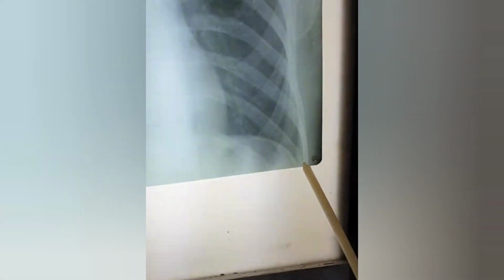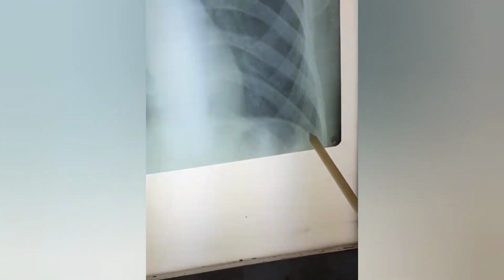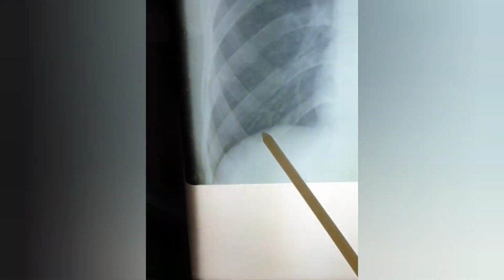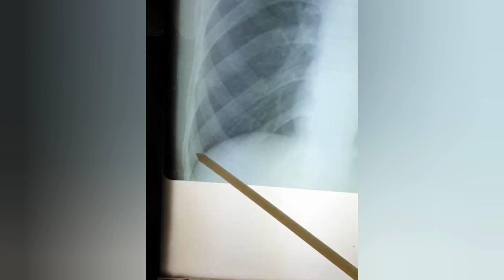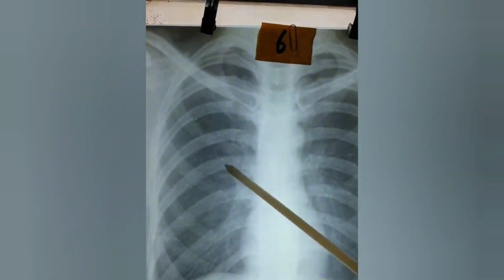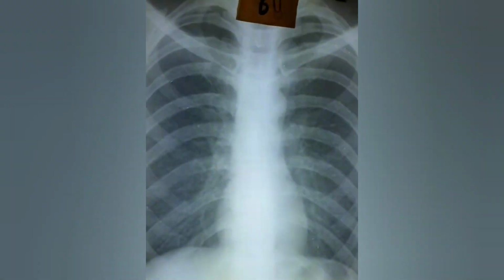What is important here is you see the acute angle here, between the heart and the diaphragm, the cardiophrenic angle. The other is the CP angle, the costophrenic angle, very acute. So much acuteness here also. So the CP angle is normal. There is no opacity. Diaphragm is semilunar, both sides normal. Cardiac shadow is normal. So in this chest X-ray, upper zone and mid zone are normal. So this chest X-ray PA is a normal view.